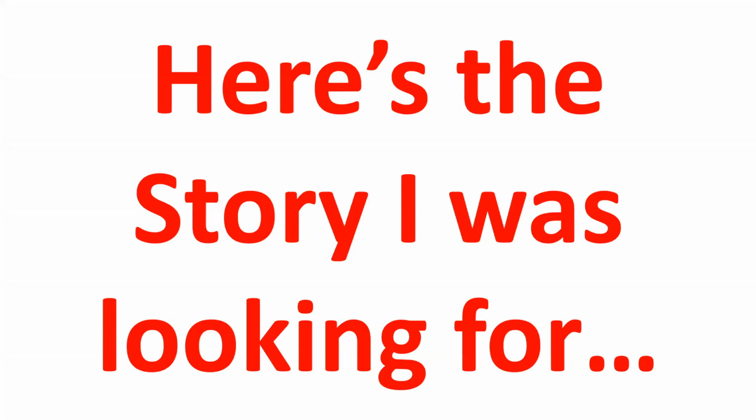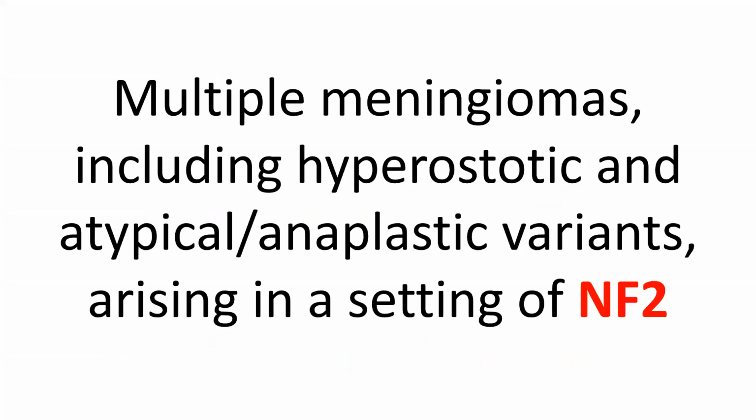All right, here is the story I was looking for. I think Dr. Cathcart nailed it first. Multiple meningiomas, including hyperostotic. Now, this is after I showed you the MRI, including hyperostotic and anaplastic variants arising in a setting of NF2. Now, Dr. Cathcart got all of that except for the atypical anaplastic because I had not shown you the MRI yet from the first image.